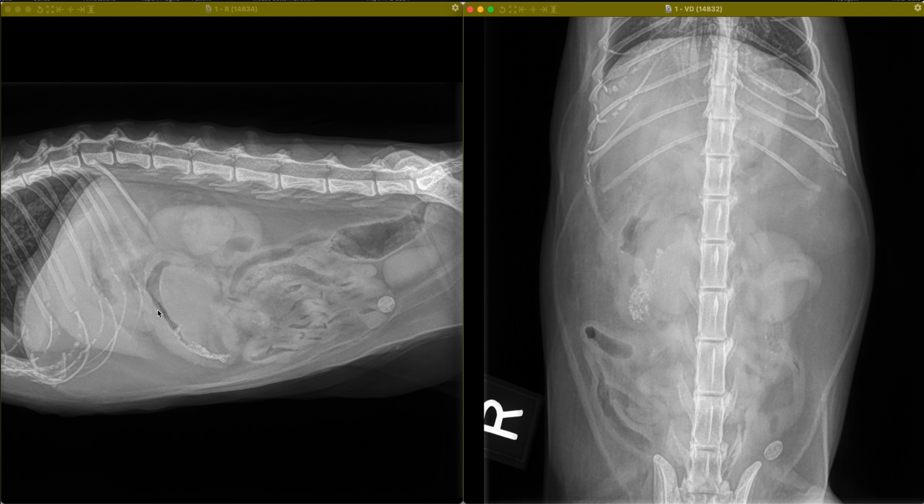There is distension of the lumen by both gas as well as accumulation of mineral material, and the segment spans approximately 3 vertebral body lengths. On the ventrodorsal view, we see the accumulation of this mineral, and we see that there's a little bit of a lobular margin to some of this portion of the central gas. Again, here we see that there's loss of distinction of sharply marginated or sharp fat opacity consistent with peritoneal fluid.